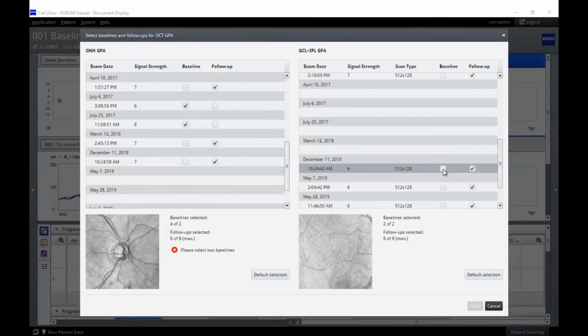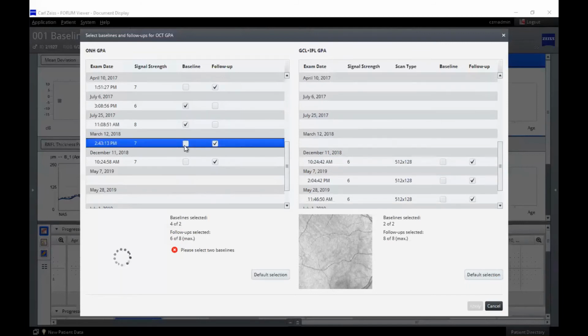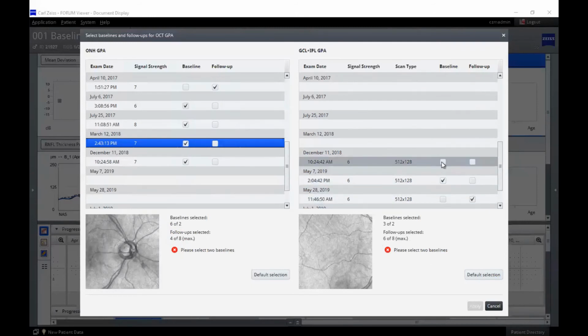We may want to adjust that baseline so that those all are in alignment. And you can see where that's, again, easily selectable within the way in which the program is set up here, where I can select these both, and now you've got two baselines that are set up. It'll give you little error messages as well down in here in terms of where your selections are at, if those don't match up with the data or the information that sits in the system.